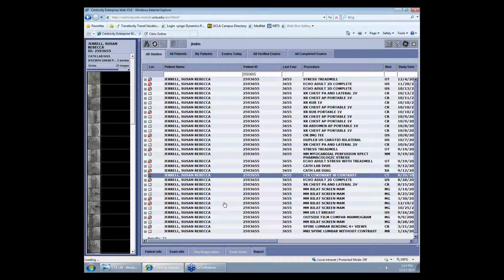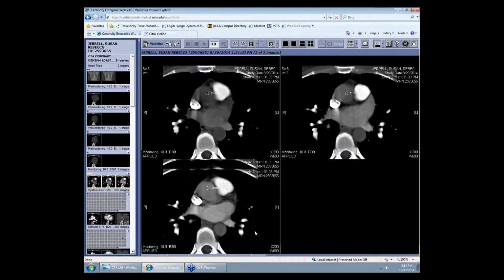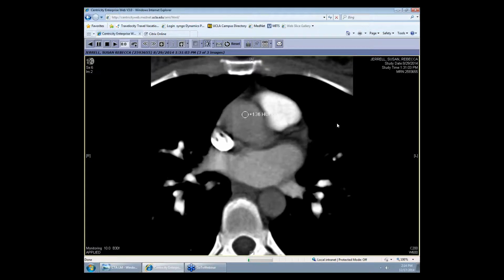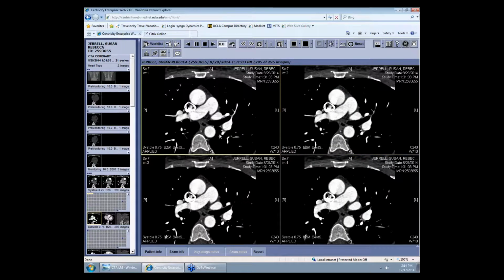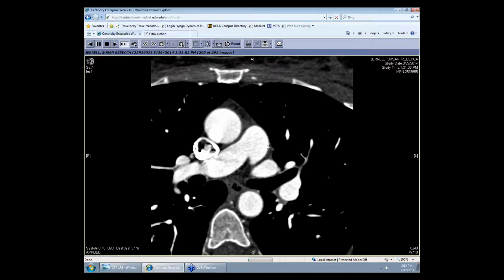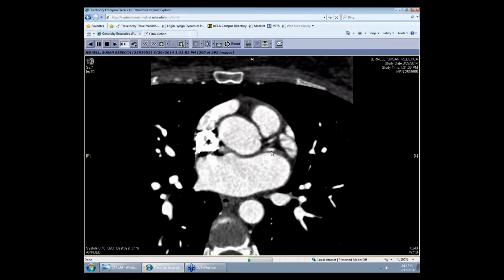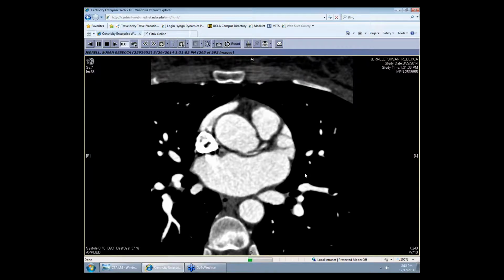That's okay. So it's not that the artery is coming off of the other cusp, but it's just the placement is a little unusual and at kind of a sharp angle. You know which one it is? But it's a little posterior as origin, no? Yes. Within the left sinus of Valsalva, but close to the posterior commissure, next to the non-coronary sinus. Can we do that? There it is. Go back. One more. Yeah. Right there. Yeah, it looks small in the beginning.